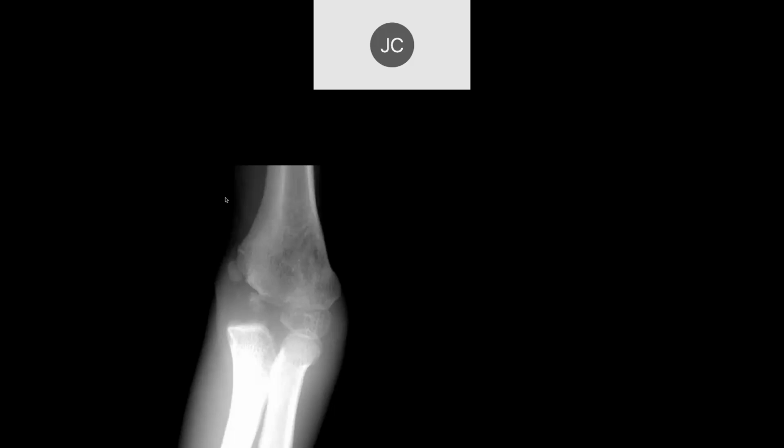All right, so we have a pediatric elbow here. How old is he? It's a very good question, and I don't know. I don't see an obvious fracture, but let's see. So the thing here is that we can see some of the ossification of the end plates, and then here on the trochlea we can see kind of funny ossification there.